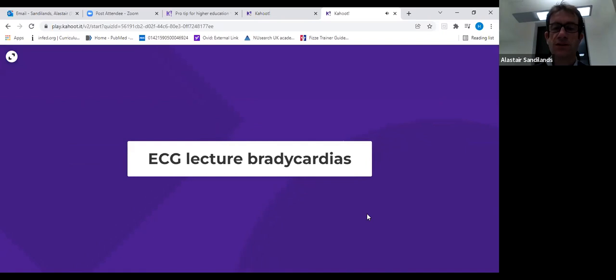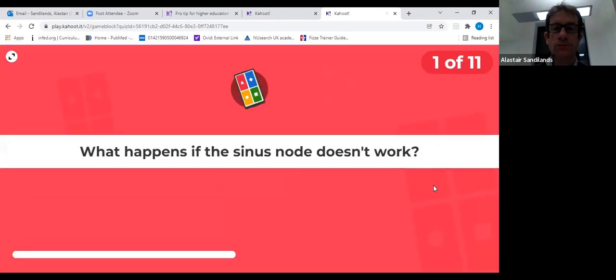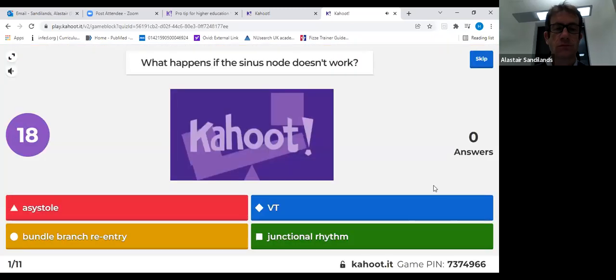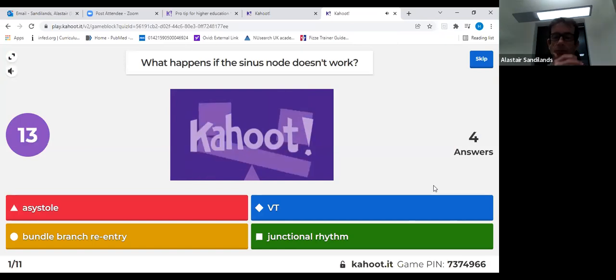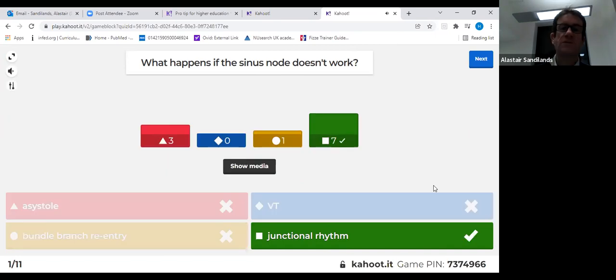So 2 questions first. I'll show you an ECG. Yeah, so junctional rhythm, very good.